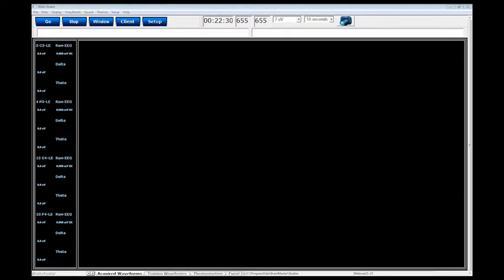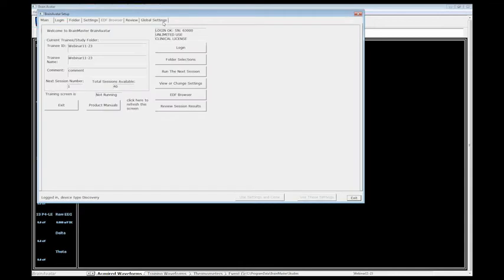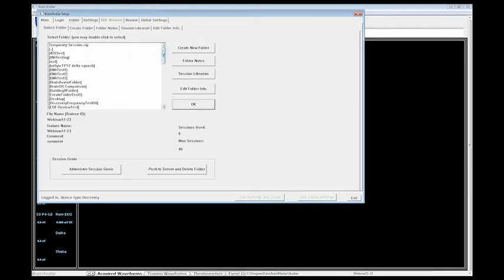Okay. So then what I will do right now is I am going to start covering how we can design a screen and have the screen now kind of be customized to who we are as a person. Now, when Ashley left you guys off last week, one of the last things she did was she imported an old settings file from an older version of software.